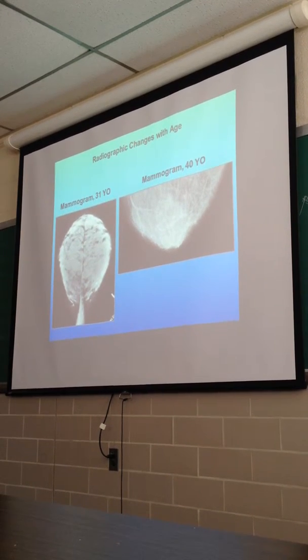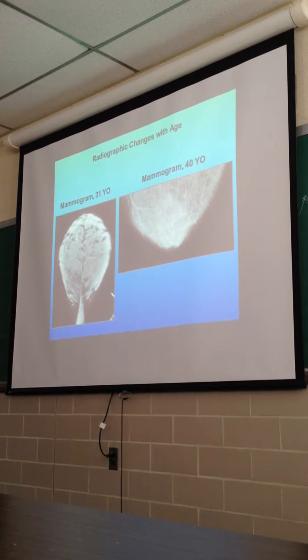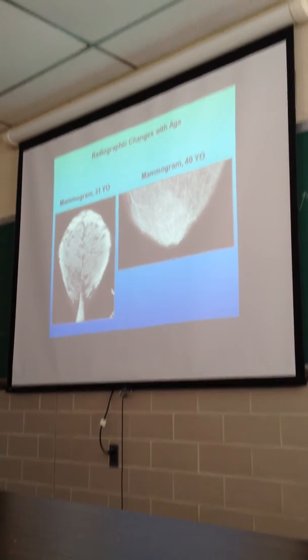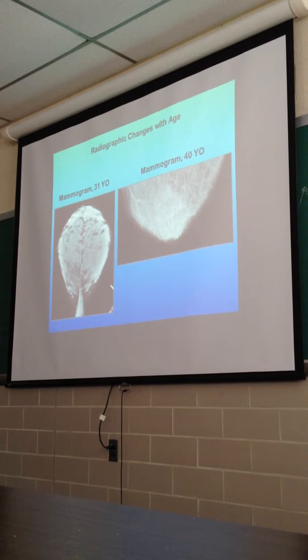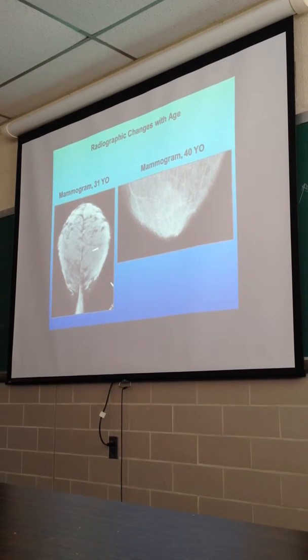You know what happens when a woman passes through the age of 35 to 40, right? Okay, here's a standard mammogram. Breasts are put side by side. Here's one breast, here's the other breast. Presumably that's left and that's right. So what we have to do here, when we have them lined up, is compare part by part as we scan across.